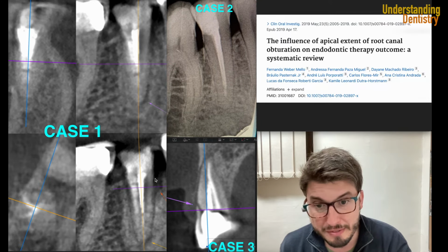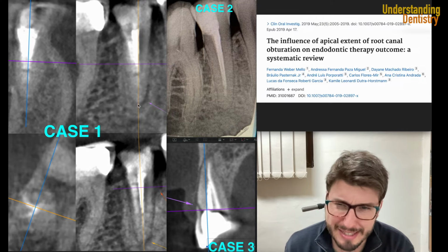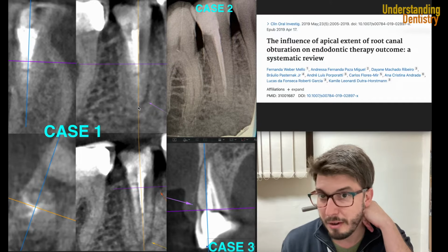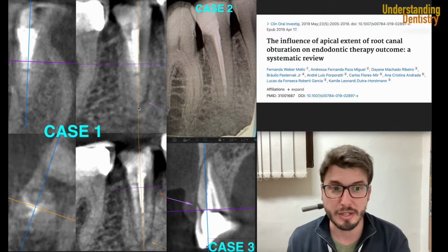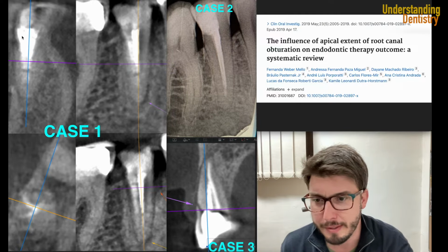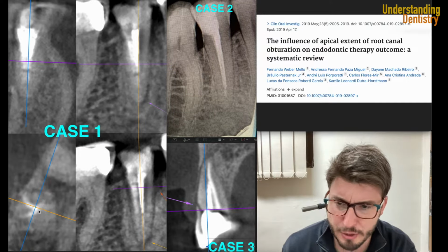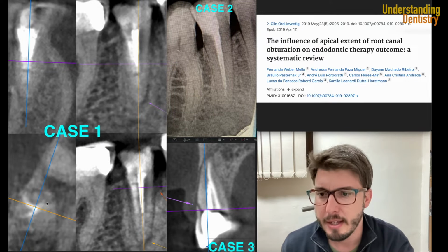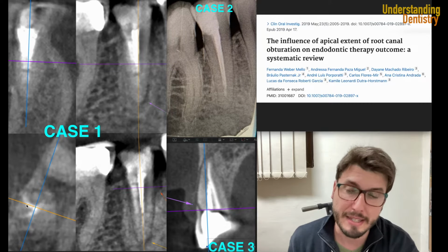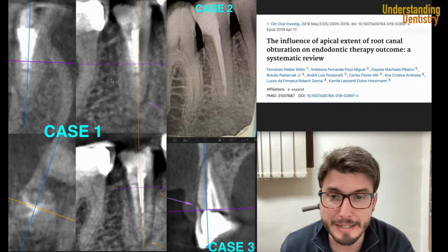But here we also have the vertical bone defect. There are a lot of artifacts. That's actually a CBCT, so that's why it's tough to diagnose, for example, fractures. The resolution here is not the best either. The other planes are not helping us a lot. Also, in the axial plane, you guys are seeing the artifacts. Those are streak artifacts, leading to those lines that are radiopaque or hyperdense, because that's CBCT. And then we have this situation.